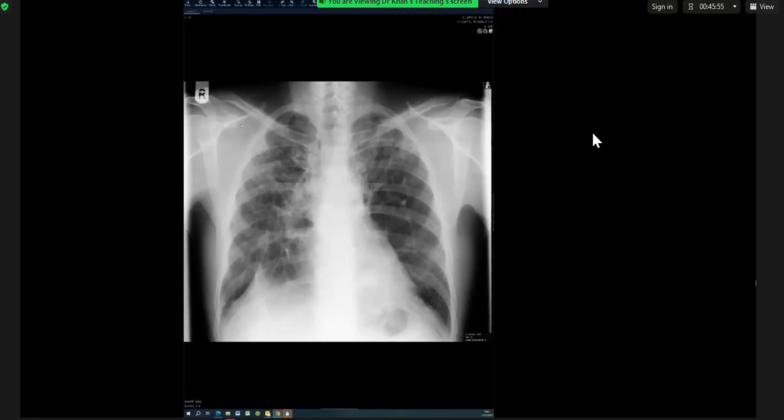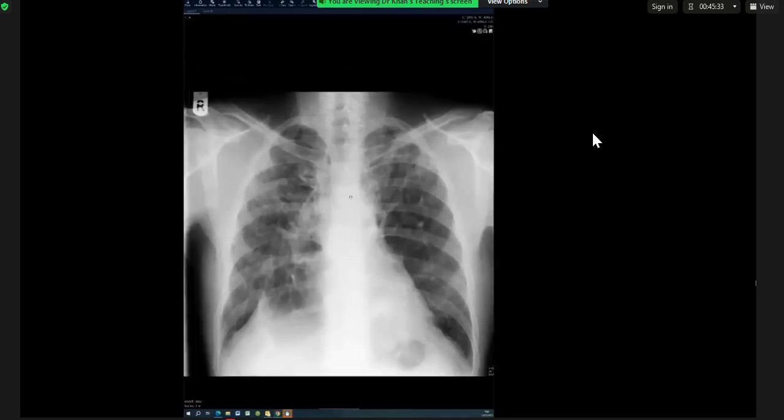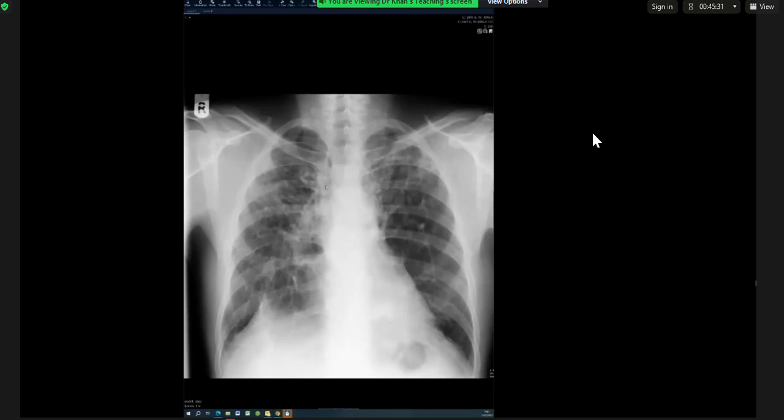So you said pneumoconiosis because of... tell me the reasons you've gone down that route. Because of the opacities in the bilateral mid and upper mid zones with a pattern of coalescing, like conglomerate masses. Okay, so I think you've jumped a bit there. You're right, there is upper to mid zone. Have you said the word fibrosis yet? Yes, ma'am. Fibrosis. So upper to mid zone fibrosis.